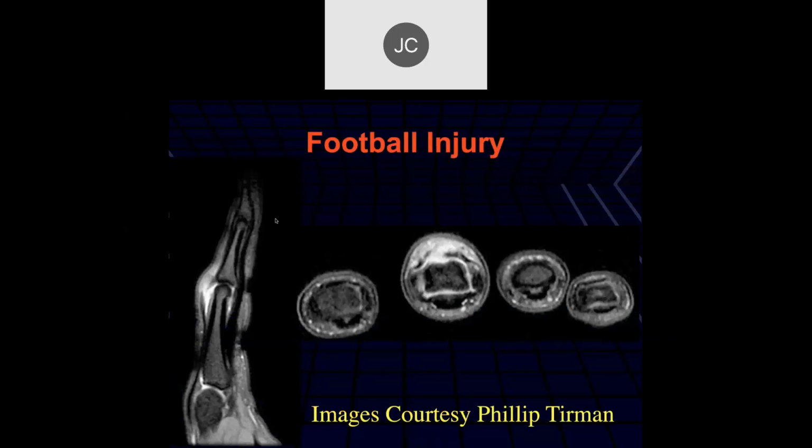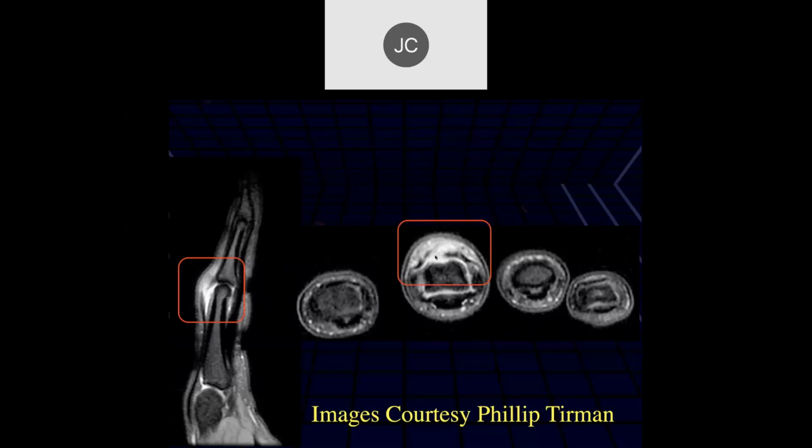Okay, let's see. Taysen, this is a football injury. All right. Looks like probably a centimeter or so proximal to the insertion of the central slip, we have a defect in the extensor tendon. Yeah. So again, this is running through here. There's the normal on either side, so we can see the clear tear of the central slip here. This patient, and that was due to a laceration.